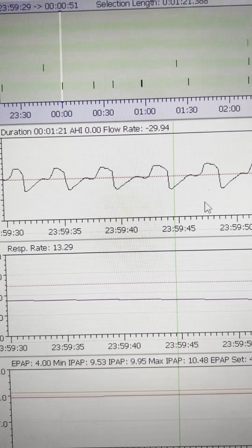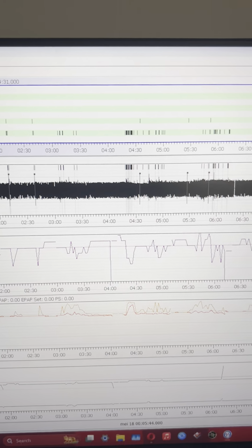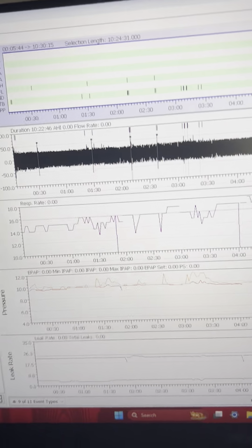And then the next one, here I went up, and I'm not sure if it actually went up or down that much. How much did the timed breaths go up? The timed breaths did go up, so there is also more under ventilation here, but it's hard to see.